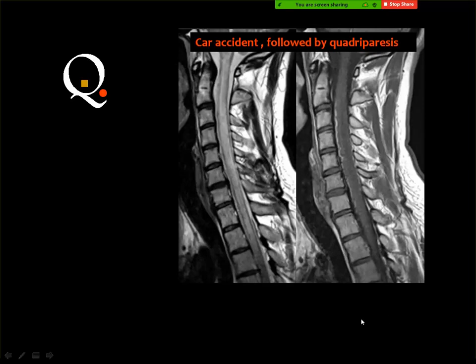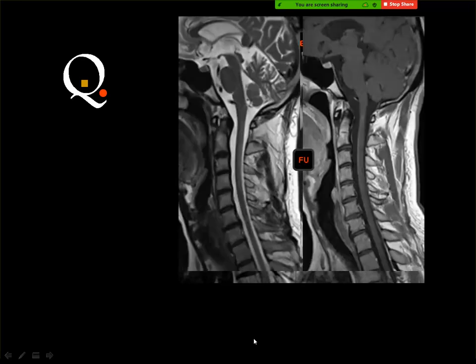And this dural arteriovenous fistula is suspected by these dilated vascular channels along the margins of the cord, and this fistula has resulted in diffuse abnormality or a parenchymal abnormality of the substance of the cord, which may be attributed to edema or ischemia.